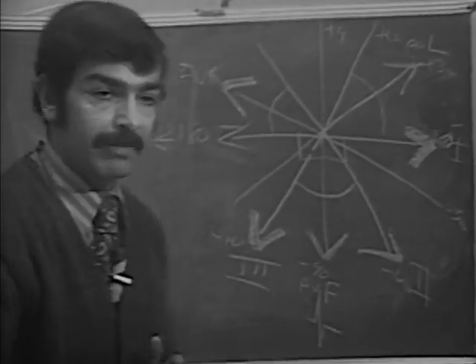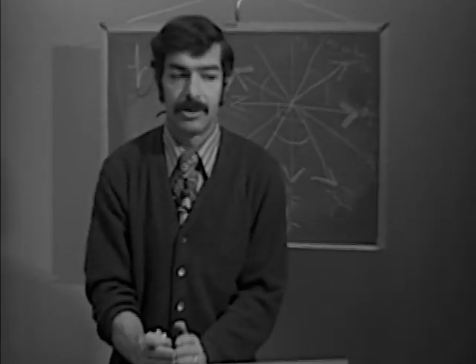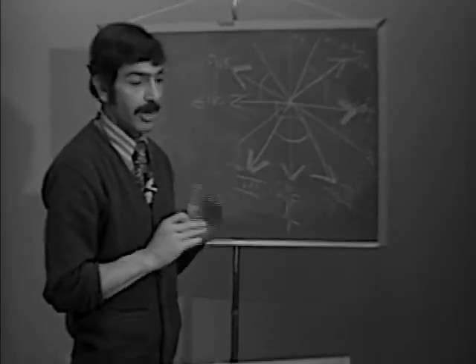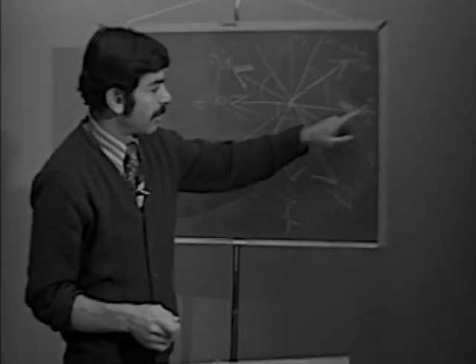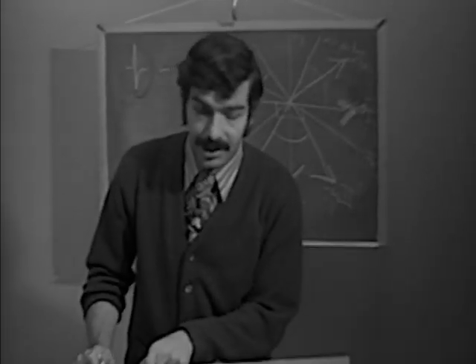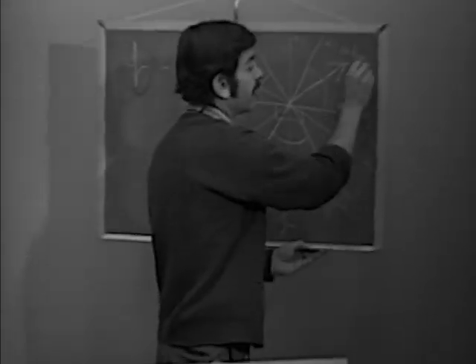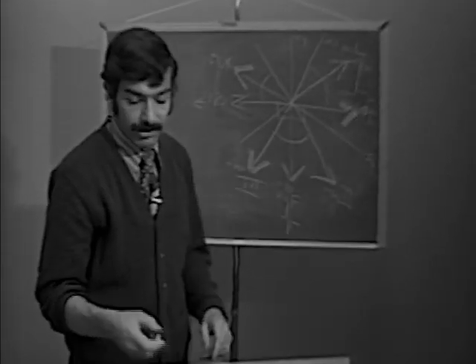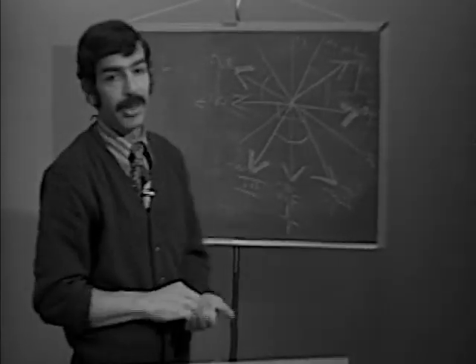So let's just take that example again. We look at our electrocardiogram, we're isoelectric in AVF, right? That means that the mean QRS is running at right angles to AVF. What lead runs at right angles to AVF? Lead 1, okay? So we go back to our electrocardiogram and ask, what does lead 1 look like? Let's say lead 1 was positive. So then our axis is 0. If lead 1 was negative, then our axis would be 180, right?